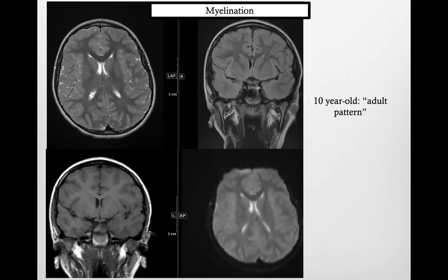I will show you some examples looking at the blood and calcium. So what we learn is that the fluid, the water, is bright in T2 and dark in T1, and white matter, that's very important, is dark in T2 and bright in T1. There is a reason why it's like that.